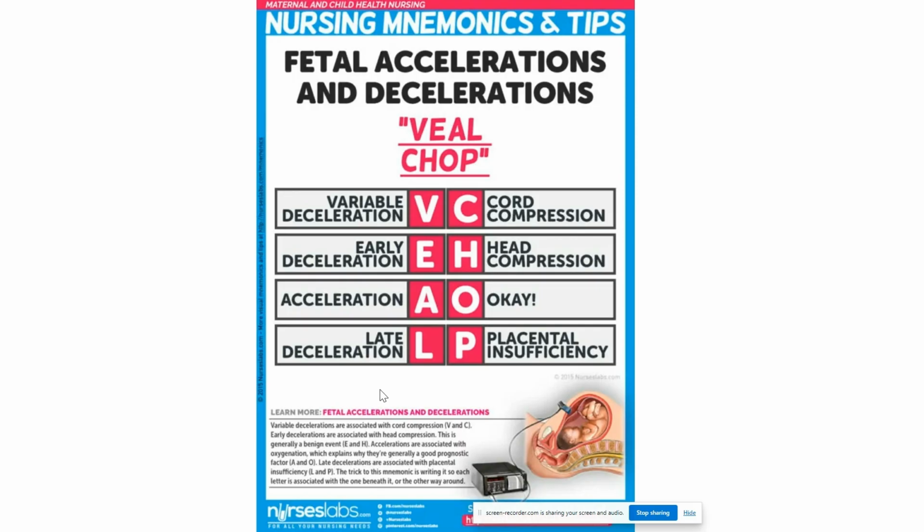Accelerations are associated with oxygenation, and it's a pretty good determination that our baby is doing well. Now, late decelerations are associated with placental insufficiency. That means that our placenta is not working. So if you're going to take anything away from this video, understand the importance of VEAL CHOP and how you can determine the difference between an acceleration and a deceleration. Now, let's move on.